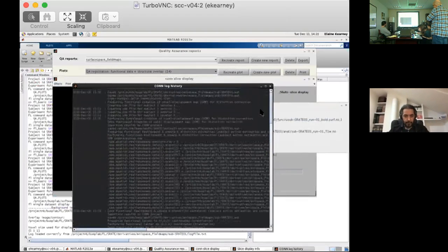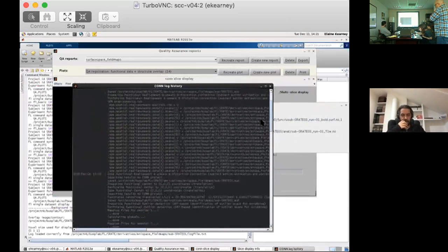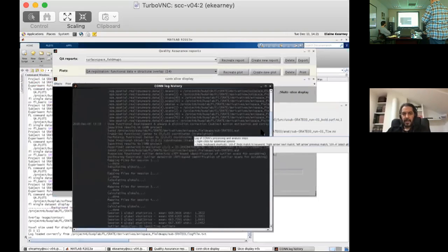So yesterday, when we looked at this, I thought that we had checked... or no, what we did is we looked at the slices, the functional data from a previous volume-based iteration. If you look at the volume-based stuff, it's the same thing. But we loaded this up, we did the QA report, and we looked at the slices for the same subject and the same slice, and they looked, to my eye, identical.